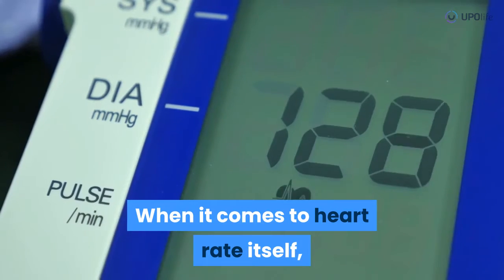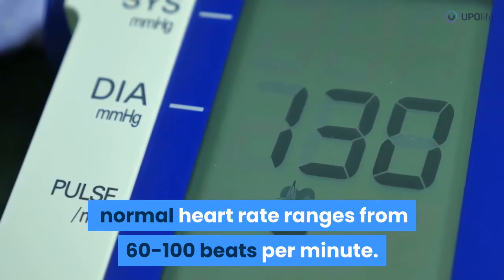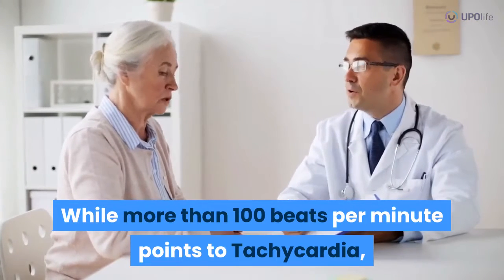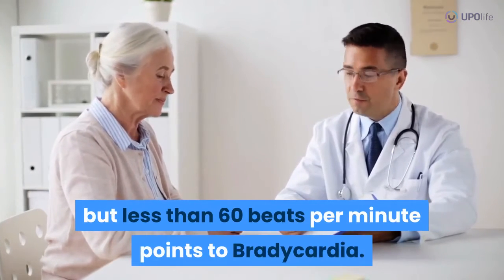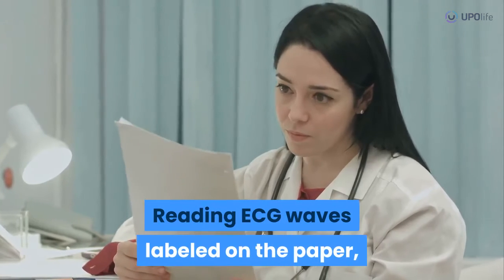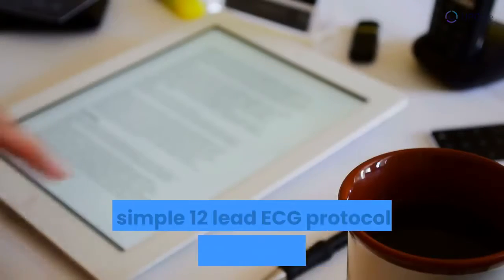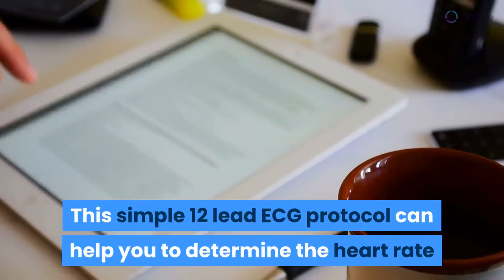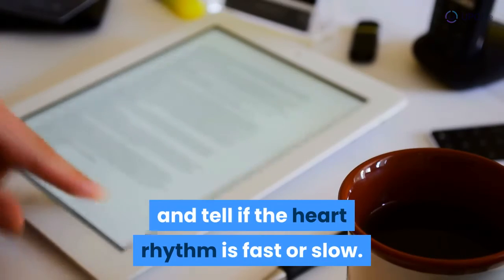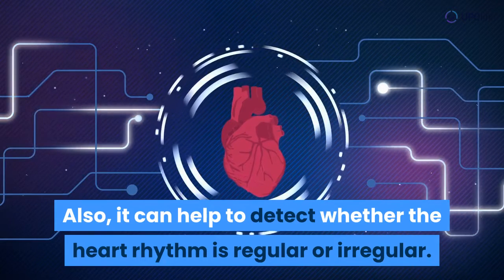When it comes to heart rate itself, normal heart rate ranges from 60 to 100 beats per minute, while more than 100 beats per minute points to tachycardia, and less than 60 beats per minute points to bradycardia. Reading ECG waves labeled on the paper, and all the values, is not as difficult as it seems. This simple 12-lead ECG protocol can help you to determine the heart rate and tell if the heart rhythm is fast or slow. Also, it can help to detect whether the heart rhythm is regular or irregular.